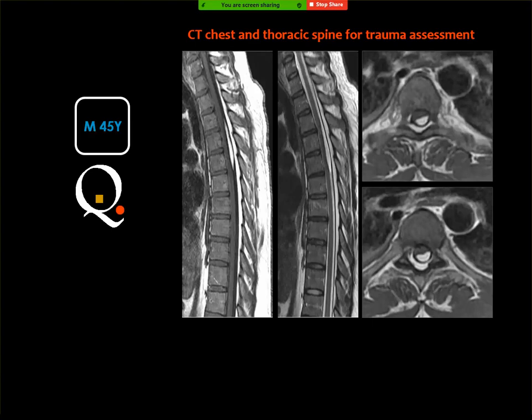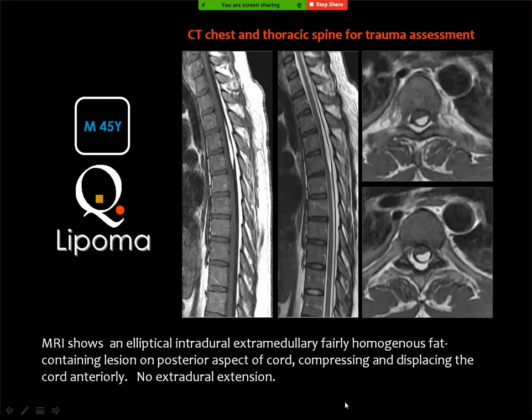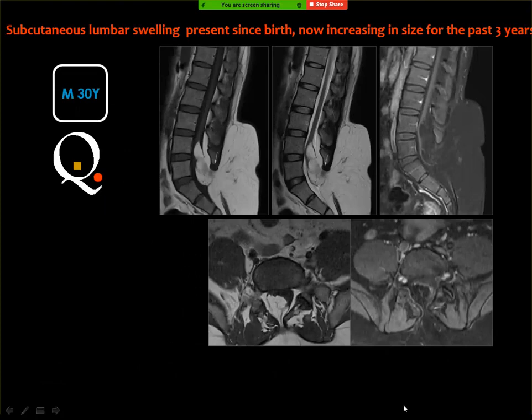Epidural hematoma. Okay, both possibilities are good, and there is a bright lesion in the T1 in the subdural space, and it is also bright in the T2 weighted image. Then both hematoma and lipoma can appear like this. In order to differentiate between hematoma and lipoma, you should have fat suppression, and this was the case of lipoma. Okay, what do you think of this?